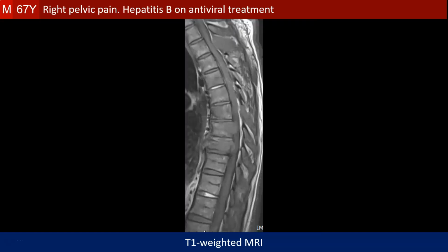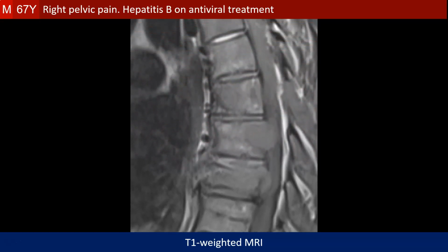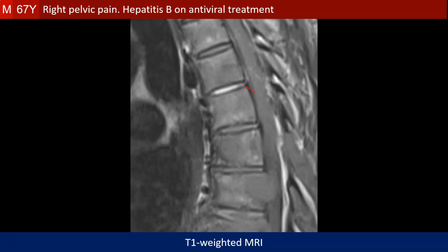The second important observation here is the presence of high signal intensity of some of the intervertebral discs in relation to the rest on the T1-weighted images. This observation has been frequently made in patients with chronic diffuse liver disease. This is a detailed view of the observation, and at a higher level also. The reason behind this observation is not known, but it may be deposition of manganese within the intervertebral discs.